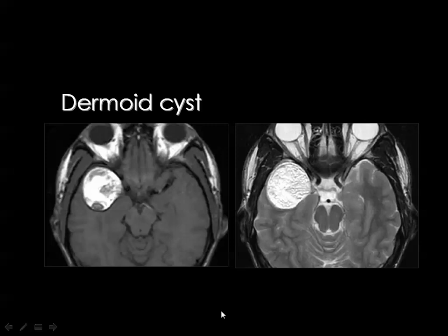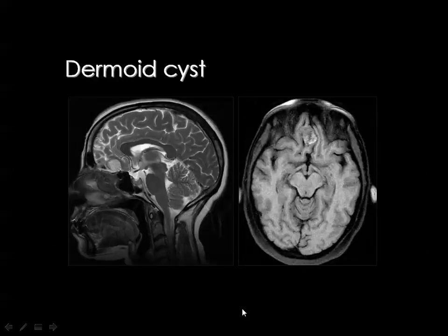And whenever you are diagnosing an intracranial dermoid cyst, you should look in the ventricles and the subarachnoid CSF spaces for fat globules. This is T1 and T2 weighted images of a dermoid cyst not in a typical location, but you can see the fat within the cyst and other soft tissue structures. You know that the sensitivity of MRI for detection of calcium is less than that of CT, and that's why you can see fat very clearly by MRI, but you cannot see calcium in most cases.